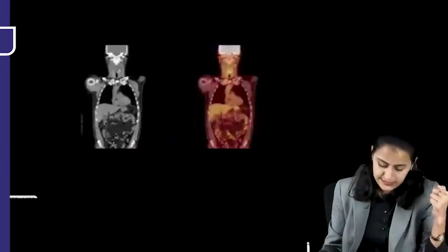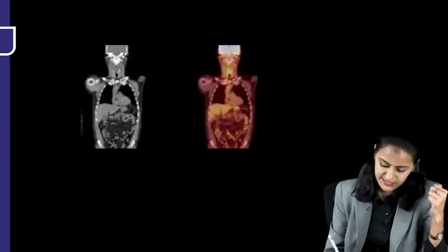Now, going to the last part, that is the NMRT, the nuclear medicine and radiotherapy. Here, we are focusing on the images part. The theory part, like the half-lives, the concept, the various scans, has been covered in rapid revision and the comprehensive, the detailed course. So, first one, identify this investigation.